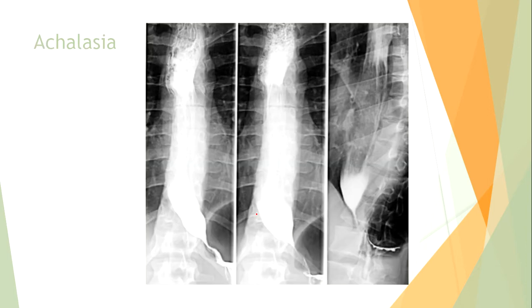First of all, the gastrointestinal tract begins from the mouth, but in the context of general surgery we don't talk about the mouth. We first of all speak about the esophagus, because we deal with it. So the first disease that you can see is achalasia, or esophagus spasm. We see here the esophagus, and we see the spasm of the distal portion of the esophagus here and here.